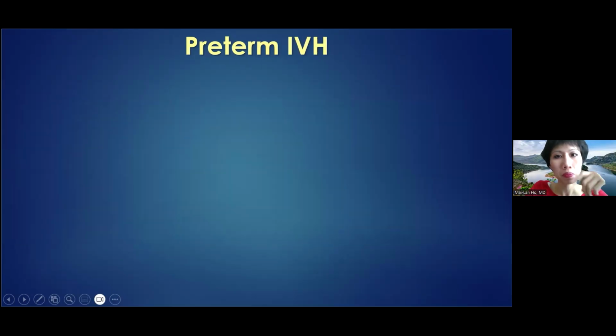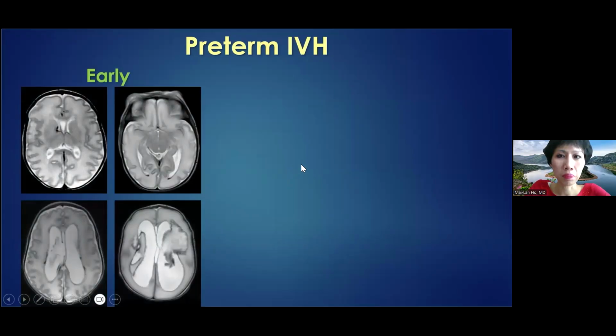Okay, so at MR, preterm intraventricular hemorrhage. So this is that grade 1 caudothalamic groove, grade 2 in the ventricle. And you see it's not just that layering, but on T2 or susceptibility, you see that dark line, right? That shows that you had hemorrhage. Even if it's completely resorbed, you can still see that siderosis. Here's grade 3 with some distension and shunting. And then here's that grade 4 where you're clogging up the ventricles, and now you have that periventricular hemorrhagic venous infarct.